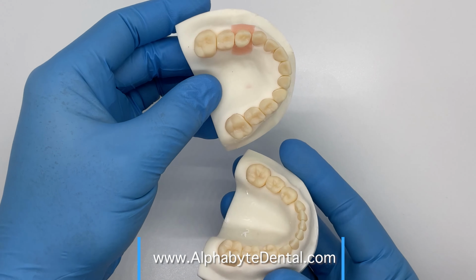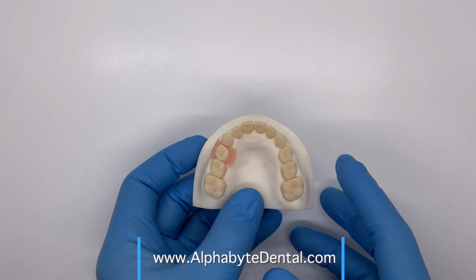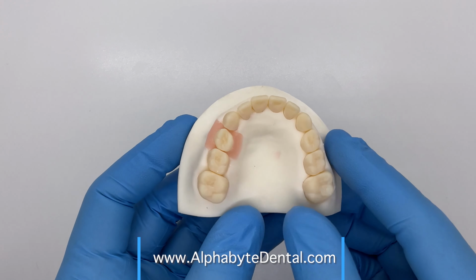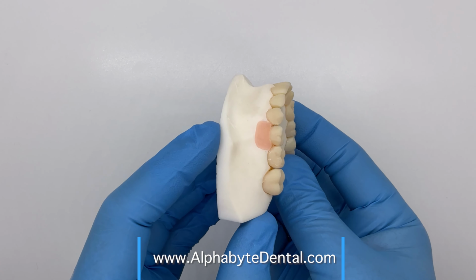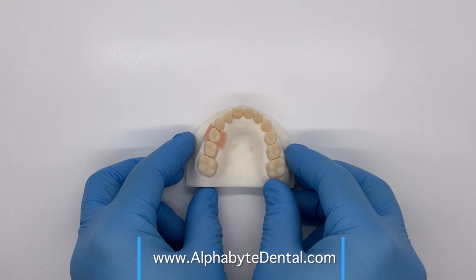We intend to roll out other features which help accomplish adjacent restorations, opposing restorations, potentially a full mouth of restorations, not just in pediatric but also in adult dentition applications as well.